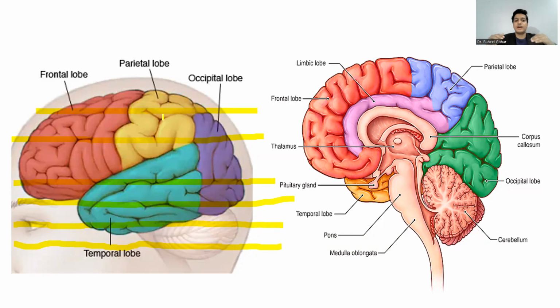So as we move upwards, what we will see, I was telling you about it. Now a very important thing is, I talked about the tentorium cerebelli. The tentorium cerebelli is not a straight structure, it is like a tent. That's why it is called tentorium cerebelli. So you can see that the tentorium will be here like this, so the cerebellum is going in the tent-like structure.